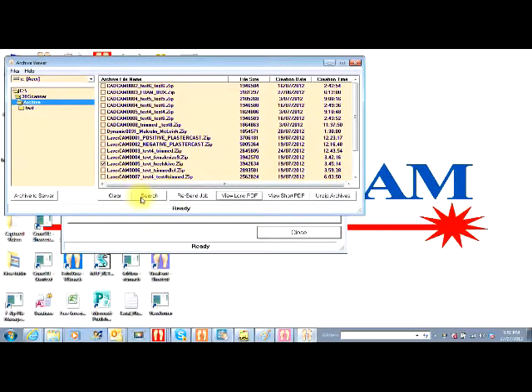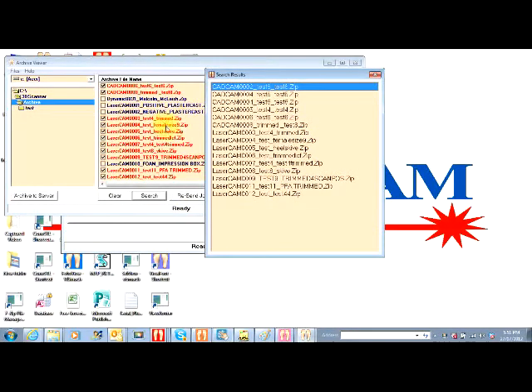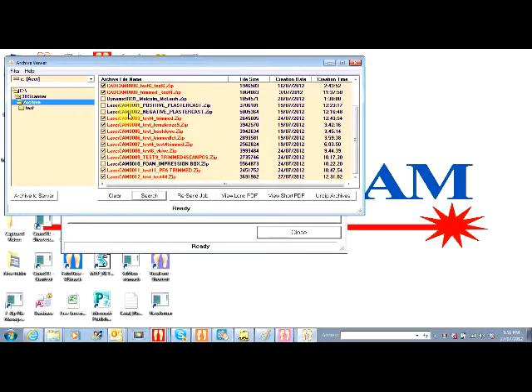The clear and search, if you're searching on a name, say called test, because we've got thousands of files now, we can put the patient's name, and anyone with test gets highlighted and brings the list up for us. And then we can open up on that particular foot. Archive to server, that's a command. That's for our backup. So once a week, we click on that, and that takes it out of the local computer and puts it onto the server.